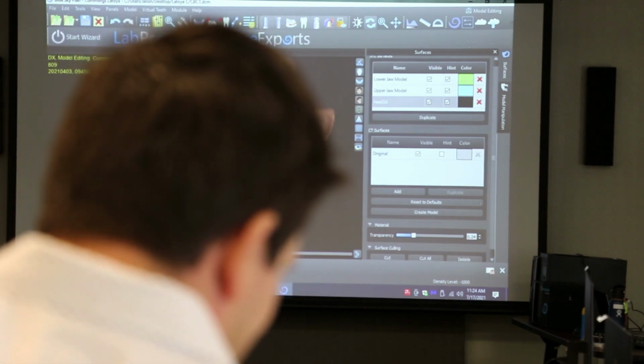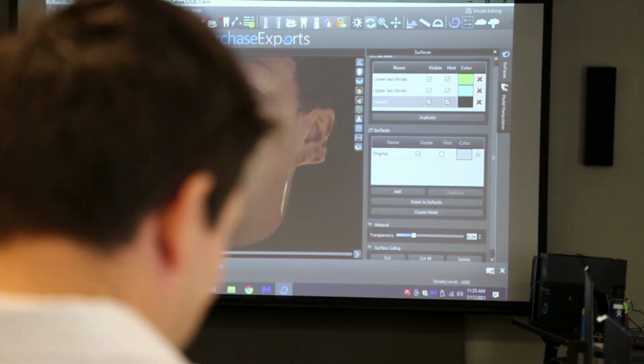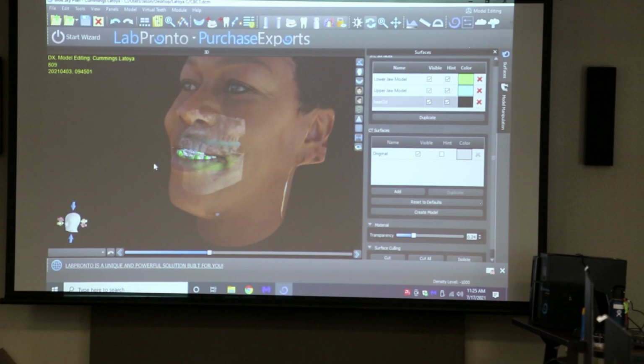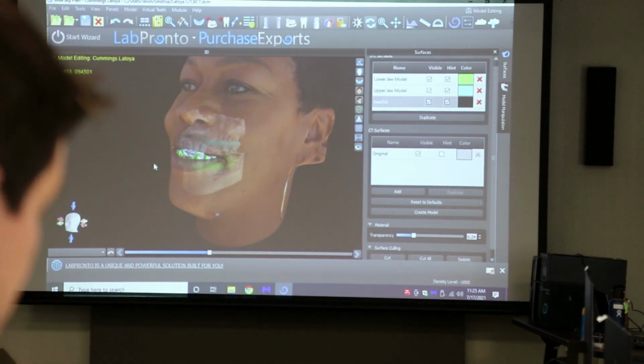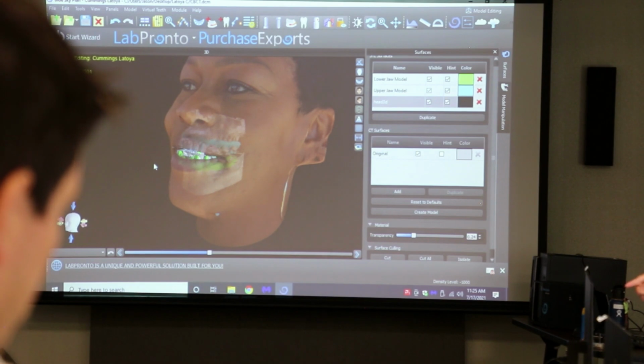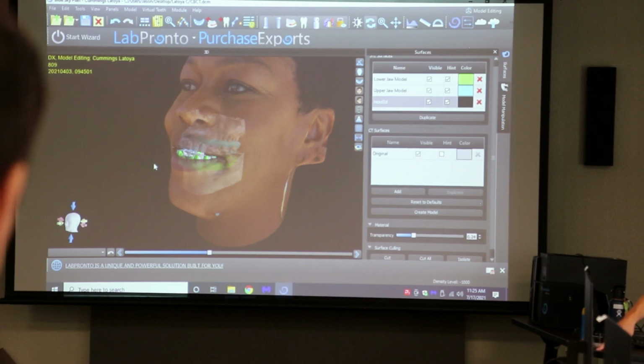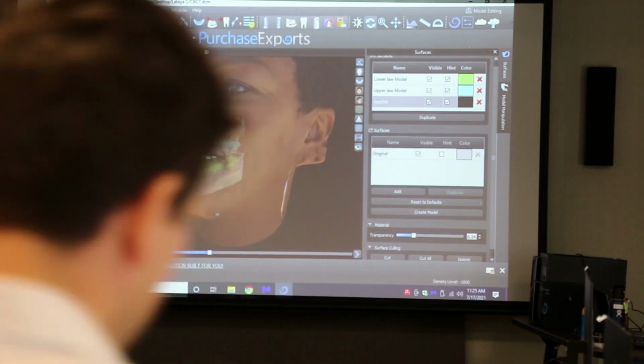You can go to the cut module and cut, but it doesn't do it quite as well. When you go to surfaces and cut out the lips, do you know what I'm talking about? Oh, yeah. So go to panels, type surfaces, and now you get your surface panel. Now click your head, and then if you click cut here, you can cut it.